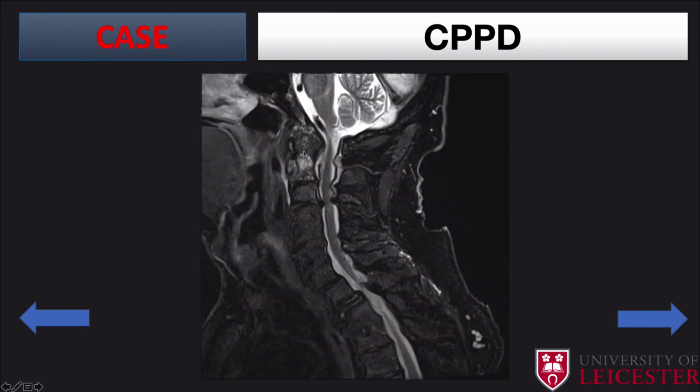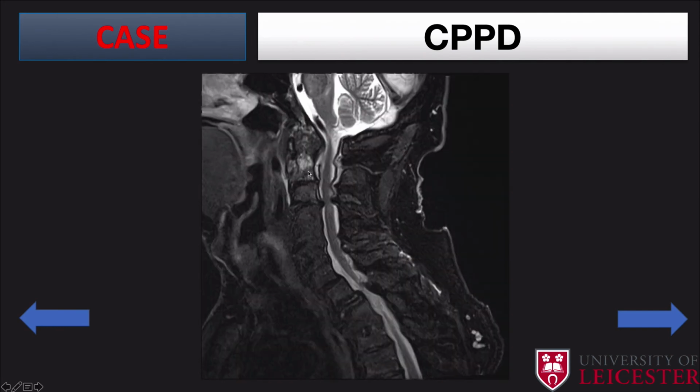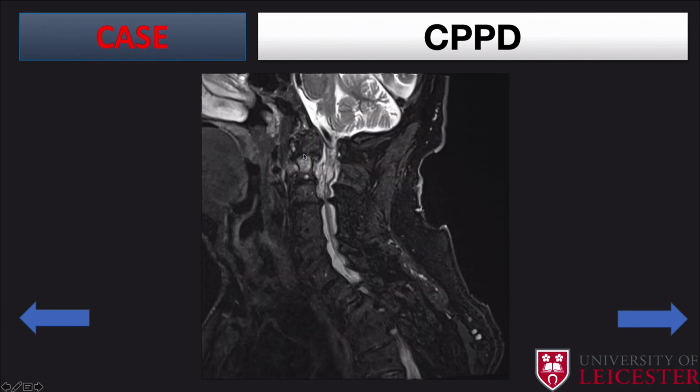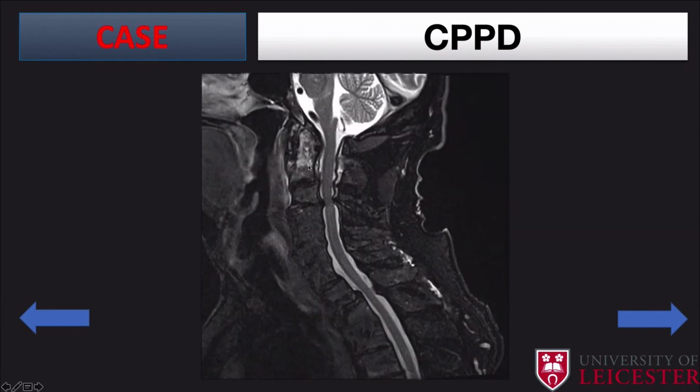Now remember, as I mentioned earlier, CPPD, also known as pseudo-gout, is called pseudo-gout because it can flare up. And this is an example where you've got an MRI in a patient with fluid sensitive sequences. So this is your CSF space, which contains fluid and is all bright. You can clearly see the spinal cord and the craniocervical junction. And you can see this high signal on the fluid sensitive sequence in keeping with edema, bone edema, and inflammation within the dens. And that extends laterally to the paraspinal musculature and also the bones laterally as well. And this is all an inflammatory component.